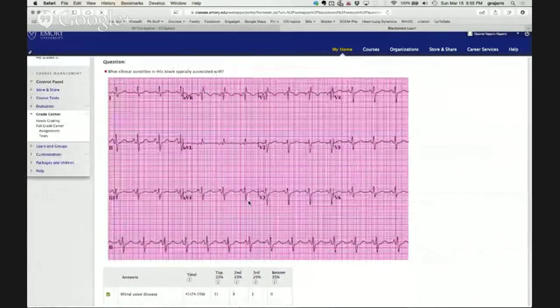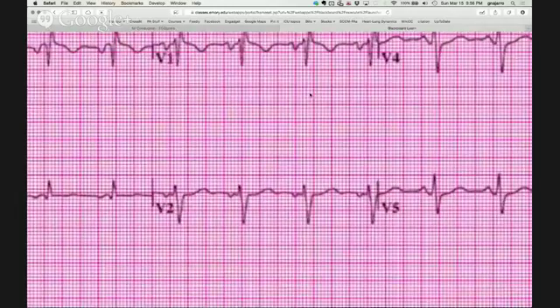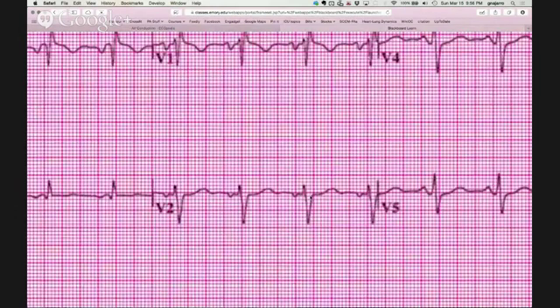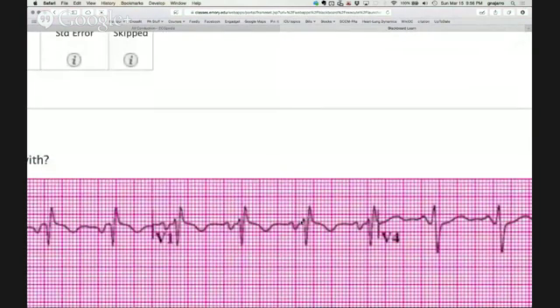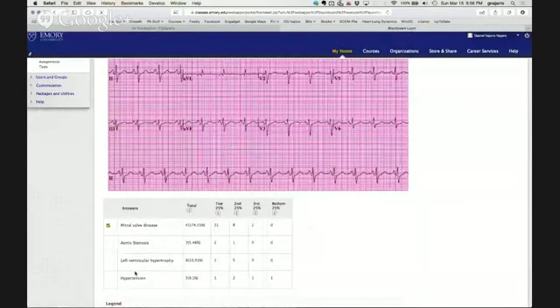This is one of the questions here. I'm trying to show right bundle branch block, and I actually ended up giving credit when I asked what the conduction was associated with this same EKG, because this is really borderline. It starts here and goes to about here, so it's exactly 0.12, maybe just slightly less. But it has this characteristic right bundle branch block. Anyways, the clinical disease state that you should pick out of this list should be mitral valve. These other things would likely cause left bundle branch.